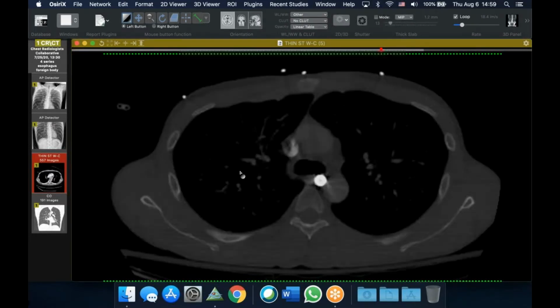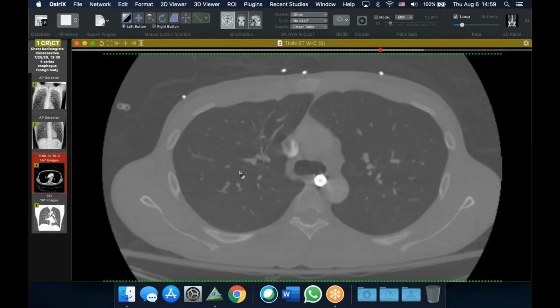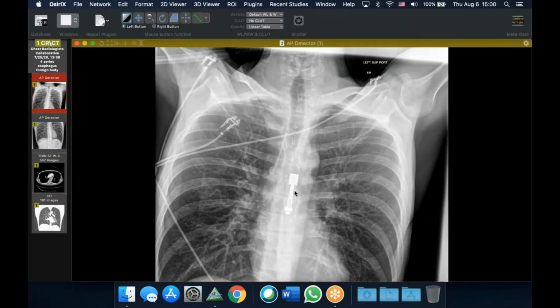Dude, awesome. A new form of vaping-induced chest disease. Thoracic injury. That's freaking hilarious. So it's just the actual cartridge. They didn't swallow the whole vape pen. I think it's small. I think it's the little insert. Dude, that is hilarious. That's probably the little vaporizer right here that, you can imagine, there's a little cylinder that connects to the thing. So I guarantee you swallowed it because you thought the cops were going to. That's what I'm guessing, because you'd figure you might aspirate it.